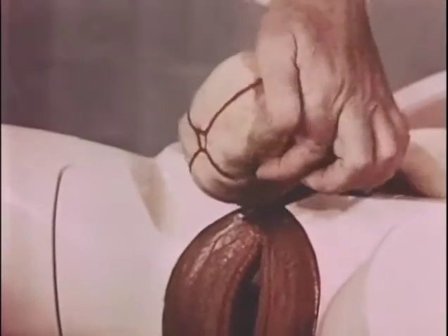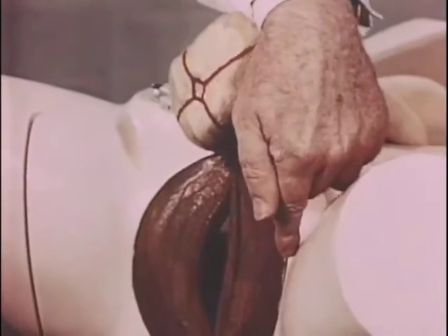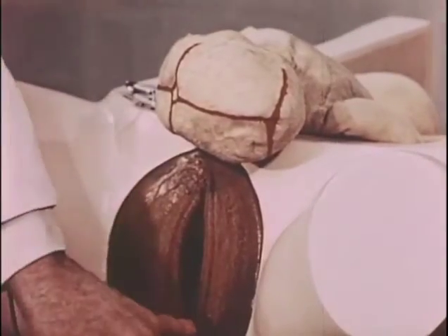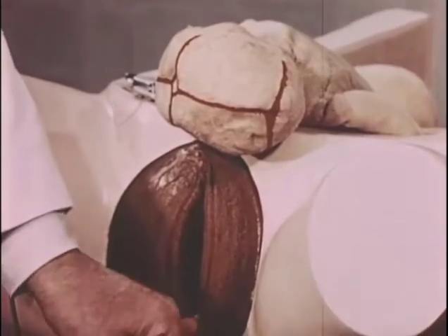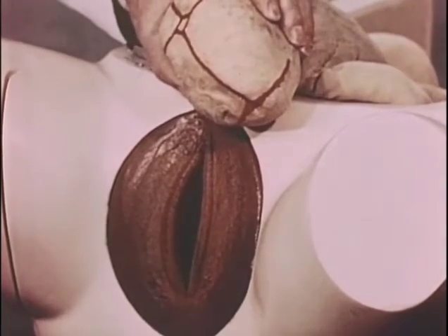In the LOA, we have a left ear, posterior on the left side. In the LOT, the left ear is posterior, directly posterior, over the sacrum. In the LOP, it's posterior. It's on the other side, but it's still posterior.